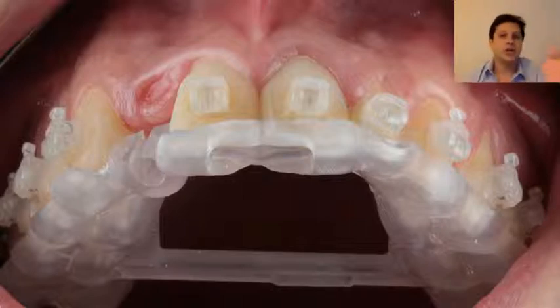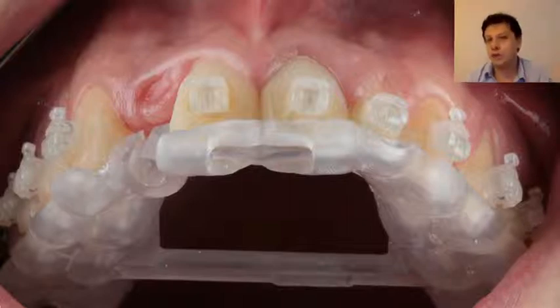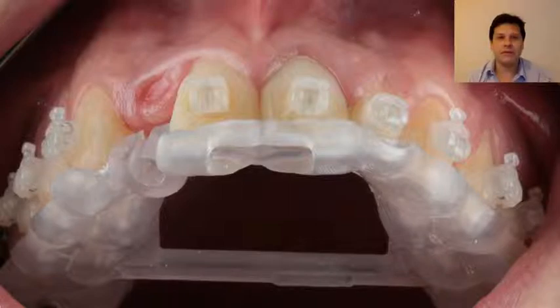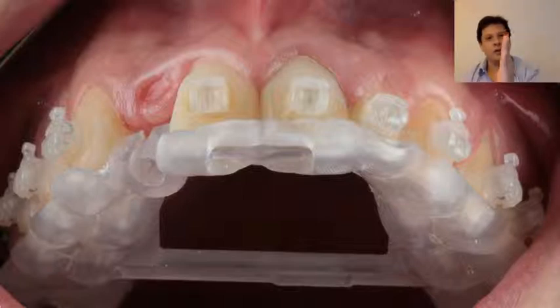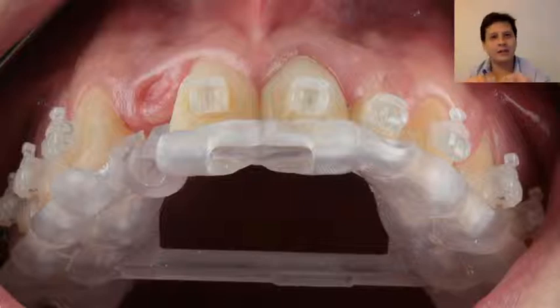Look at this picture. You have brackets everywhere. To do an impression in these cases? Of course not. Very difficult. So you're going to do a digital impression to guide you in a 2.9 situation freehand? Of course not. It would be impossible. You have to open flaps everywhere in order to be sure that you're in the bone. To do a screw-retained restoration on the lateral incisor is also very tricky because you know that the offset of your implant will tend to perforate that buccal wall. So you have a lot of variables. It looks like a straightforward case, but it's not a straightforward case.